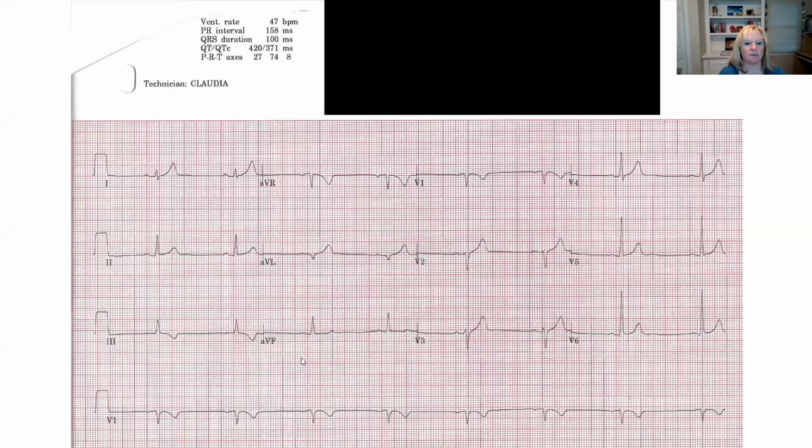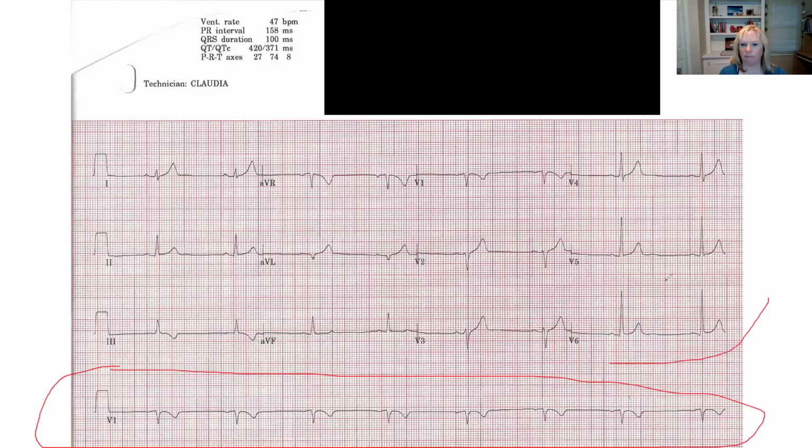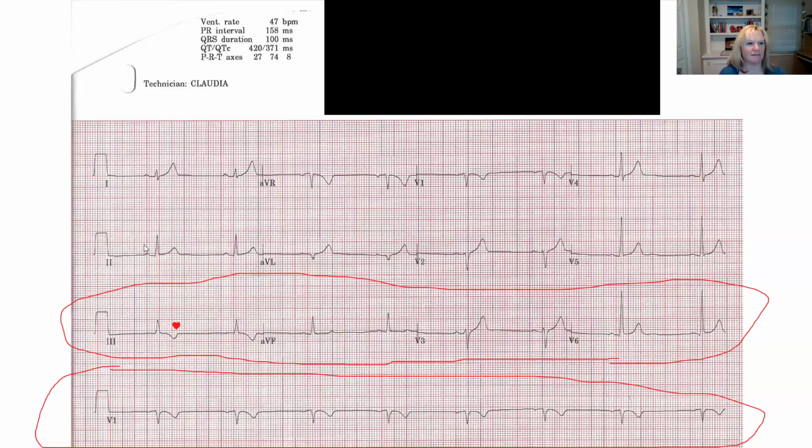This one, I want to ask your opinion. I'm going to show you the rhythm strip. Let me move this. I'm going to show you the rhythm strip, and then I want to hear your opinion. This is our rhythm strip. Here or here. Okay? So, first things first, is this... okay? Yes, I agree. There's some inverted T's. Agree. Okay, but is this sinus? It is sinus. Good. Always go to lead 2 if you're wondering. Okay? Always go to lead 2.